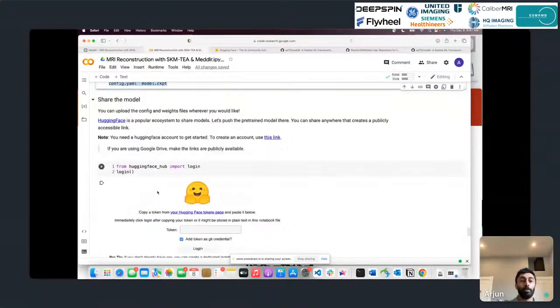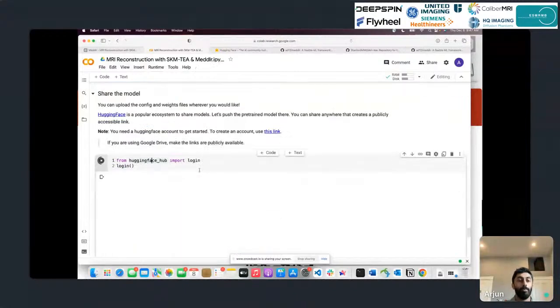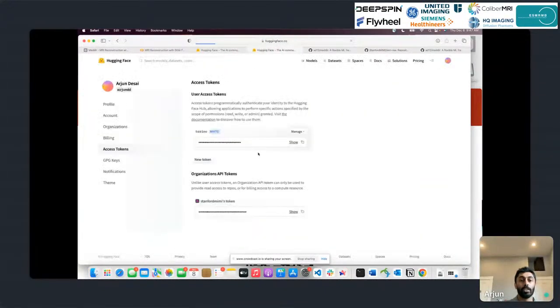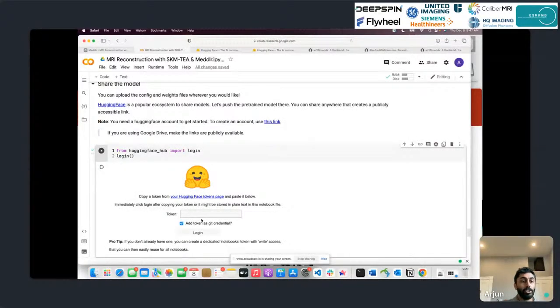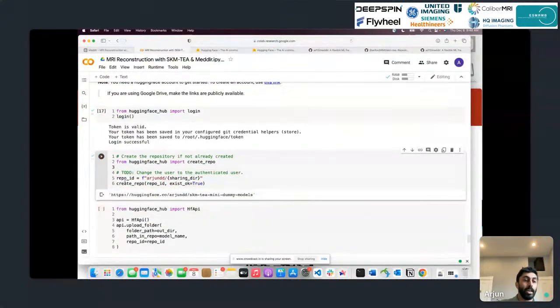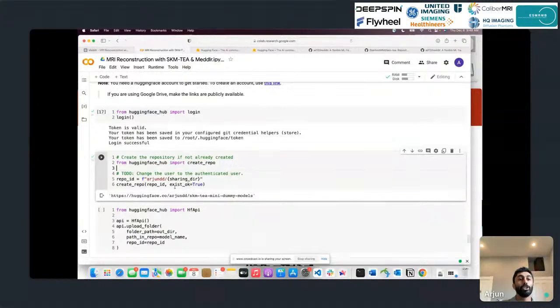So we're just going to upload this model to Hugging Face. And if you want to also do this on your own, feel free to. You'll need to make a Hugging Face account. So I'm going to go ahead and look at my tokens, copy that, log in. It should authenticate me. And then I'm going to go ahead and create this repository. What we've used are Hugging Face utilities for taking the folder that we had and pushing the config and weights file onto some kind of folder on Hugging Face. And this is the URL to that folder. So we'll go ahead and navigate there.